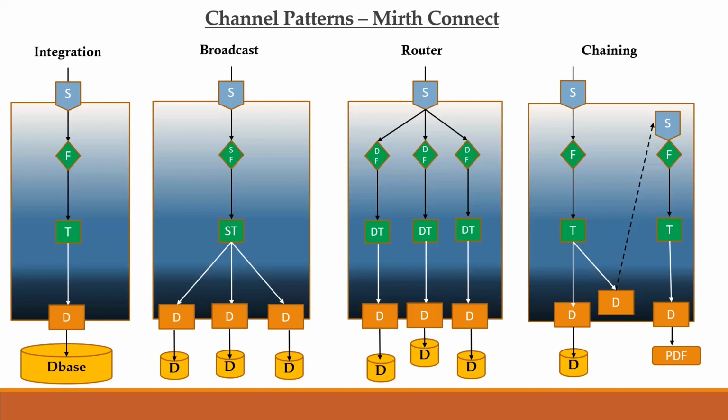So how we can implement that scenario in Mirth Connect? So what you can do in that scenario is in Mirth Connect, you can configure the source to receive the data from that registration system so that as soon as the patient is registered, we get the data into Mirth Connect. Once we receive that data, you can apply source filters and transformers if there is anything that is needed. And once that is done, you can have multiple destinations, one destination pointing to each of those EHR systems. And as soon as the message completes the source side of it, the same message will be replicated to all of these three destinations. So that's the default behavior of Mirth Connect.